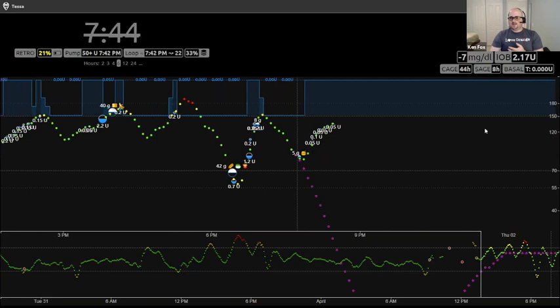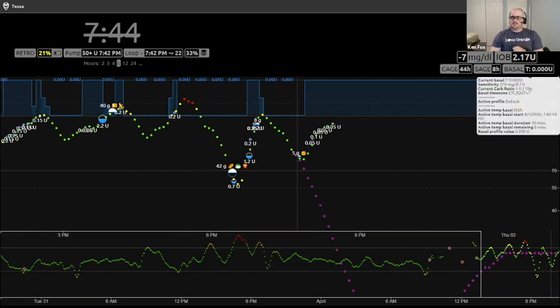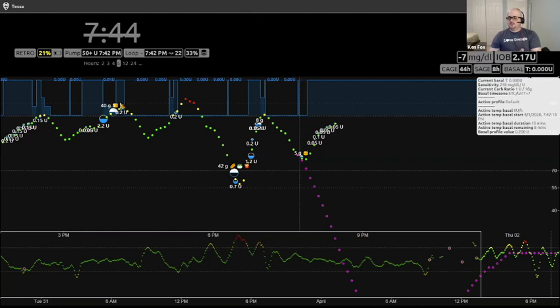Here, you'll get a T in front of, there we go. So you'll see a T colon, that means temporary basal. This will show you her sensitivity at that moment in time, current basal rate it's running, and the current carb ratio, that kind of stuff. So when you see a T, it's running a temp basal of some kind. So there you go. And you get more information there when it's a temp basal. So you get all kinds of stuff there. Okay.